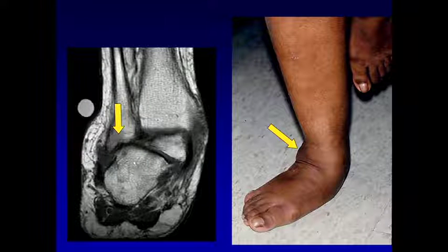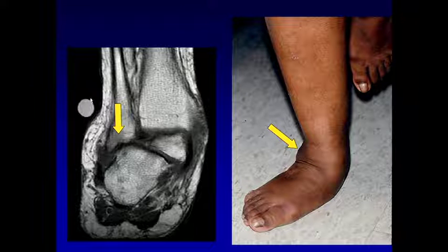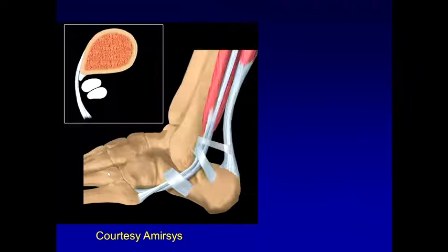This is a patient with now calcaneofibular impingement. The calcaneus is in so much hindfoot valgus that it is impinging on the fibula. Notice that the marker is lateral right here. The marker is lateral, compatible with pain along the lateral aspect of that foot.